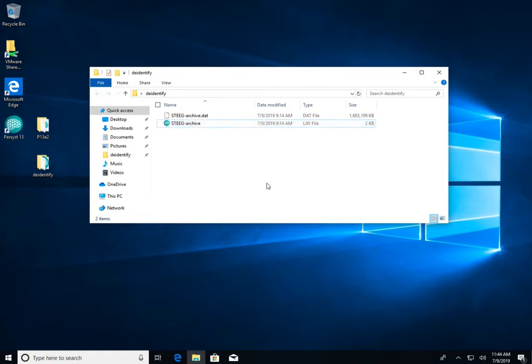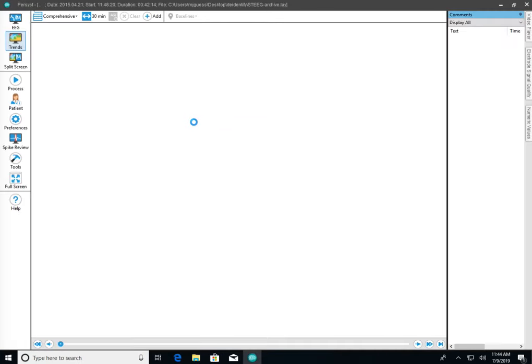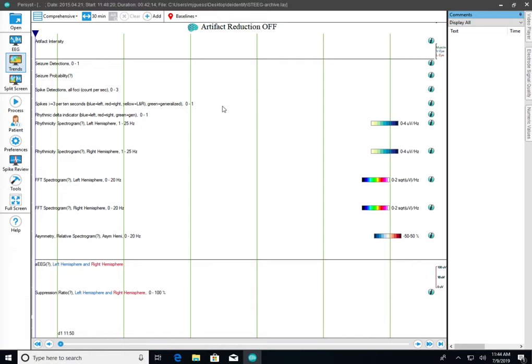I'm going to go ahead and double click on the lay file. This has been archived and de-identified. And we'll go ahead and launch Persist. This shows up initially with trends configured for 10-20. That's okay, we're not going to use those at this point with this recording.